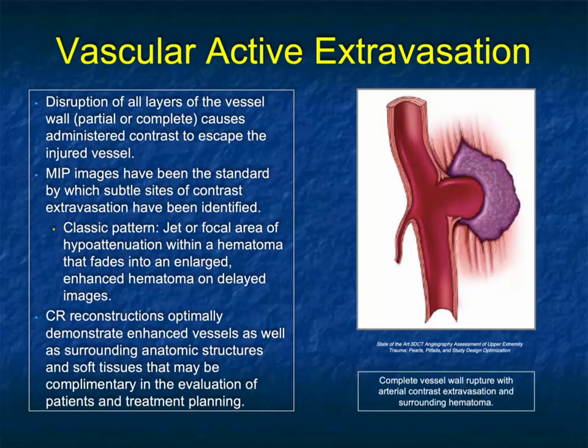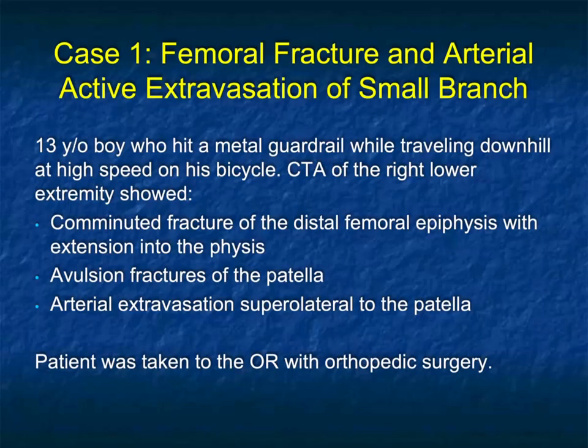You want to be very careful, particularly when you have contrast extravasation, that the computer doesn't confuse contrast with bone and remove the contrast. So regardless of how you do the study, you always need also to look at the native vessels. So let's look at some cases.